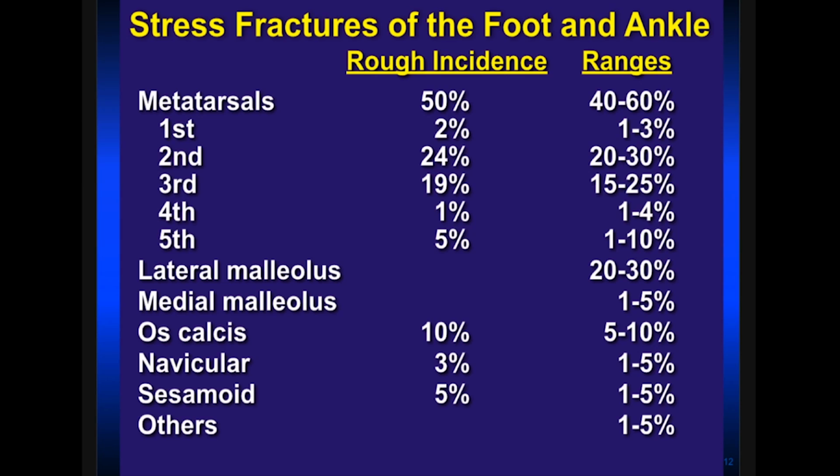Sesamoid fractures can occur. You can also have a bipartite sesamoid. Differentiating these two, similar to a bipartite patella, is the appearance by radiographs, and also workup can be done with bone scan or MRI scan.